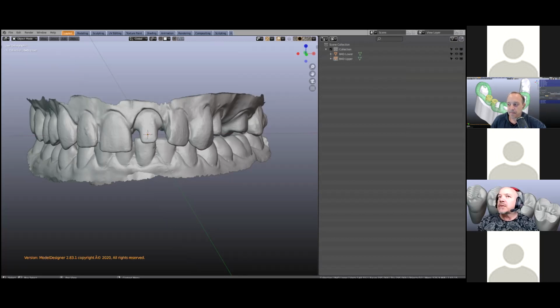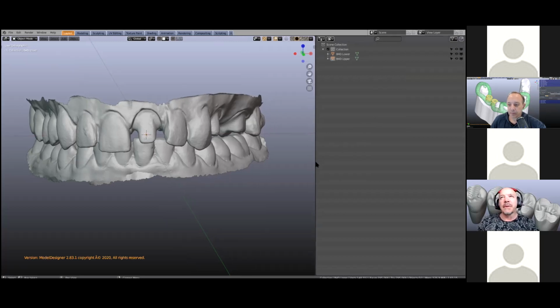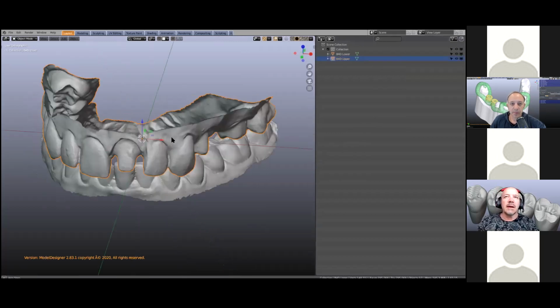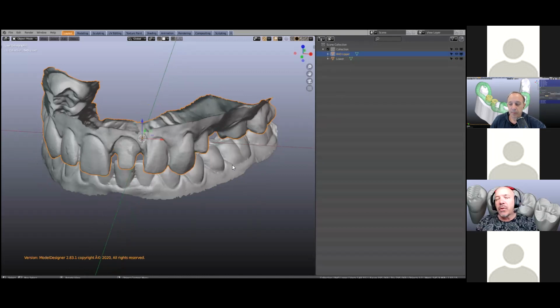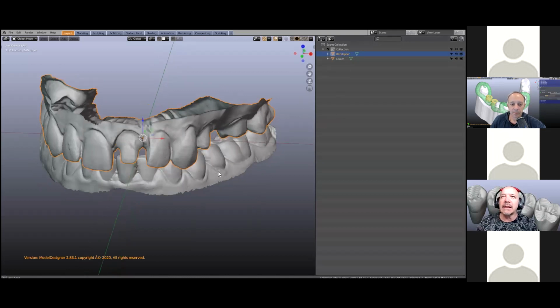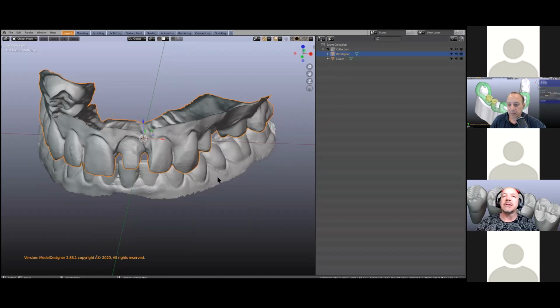And object names are very important because this is how we manage our objects. For example, now this one here is called B4D upper and B4D lower. You may want to change the name, and so if you want to change the name, you just double click and then you type in lower, enter. Oh yep, and then you've changed the name of the object. Colors are very important. We work with names and colors, and the third one is collections.